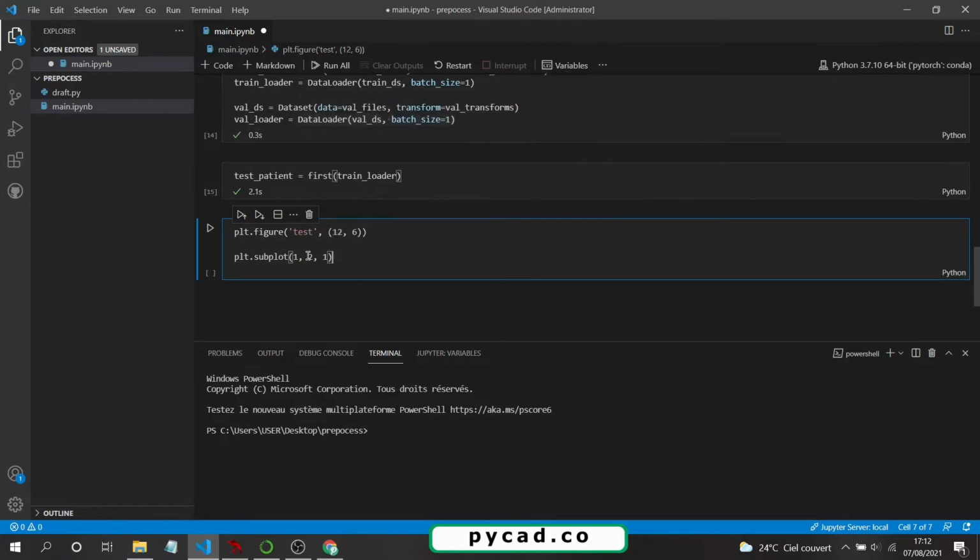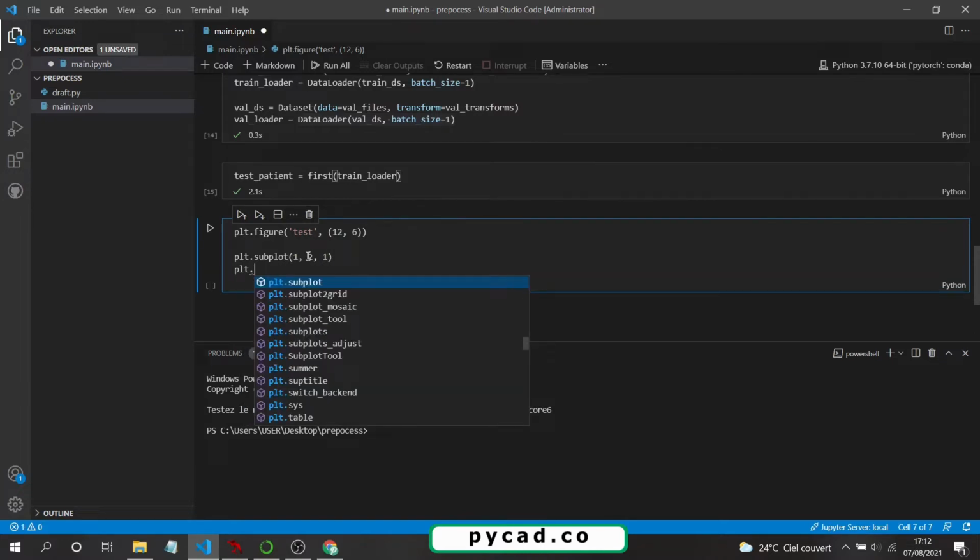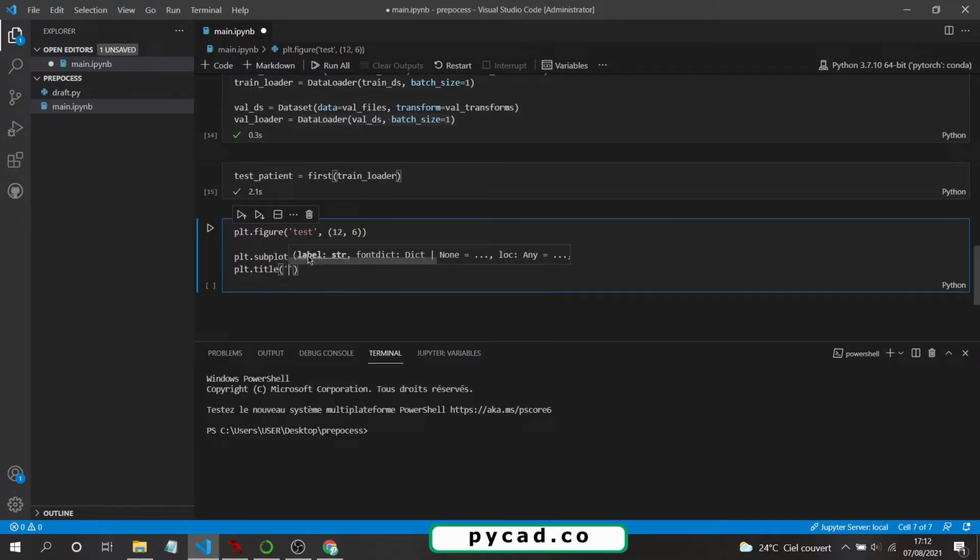I want this, for example. Now what we will do, we'll create a title for the first part. So here we have plt.title. Then here I will put something like "slice of a patient." Why not? You can put anything you want here.